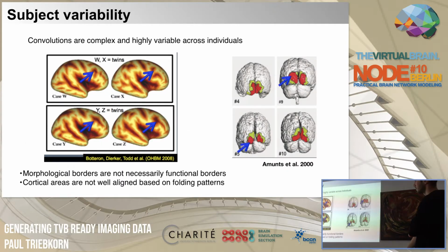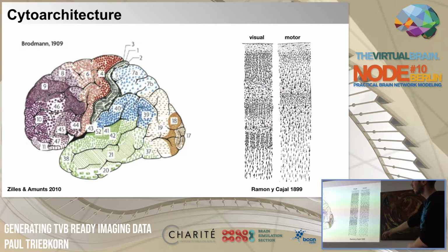So how do we map this then to the subject? Well, let's go back again. We can use certain anatomical landmarks. So some gyri and sulci are very pronounced, and you can find them in almost all human brains, right? And you can say, based on these landmarks, where a certain area should lie, and from there on map this to the subject brain.